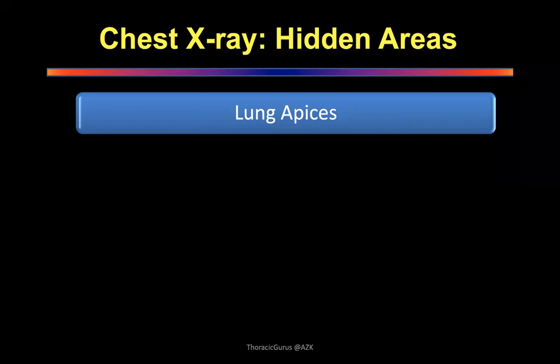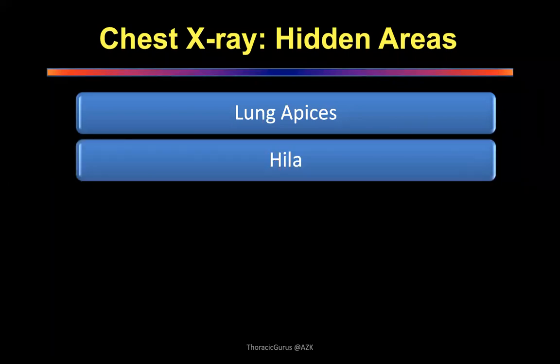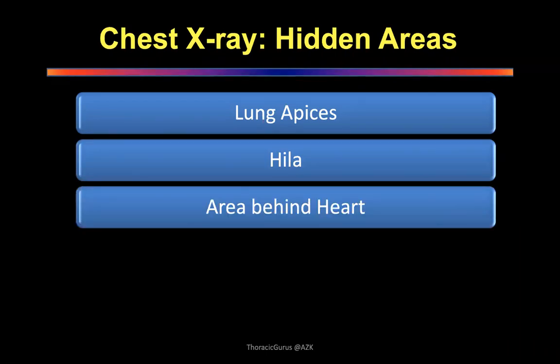So don't forget that everything that you see may not be cancer. Sometimes simple calcification of the left upper rib, of the first rib coming anteriorly, head on towards you, may actually feel as if there is a cancer there. So it's important to take a lateral film, and that will do away with that complex. The hilum is a very complex area. It's very difficult to diagnose things unless you're used to seeing the hilum hundreds of times. So whenever you see a chest X-ray next time, please follow this pathway which I told you and look at each one of these structures, and you will be surprised how much you will find within a chest X-ray.